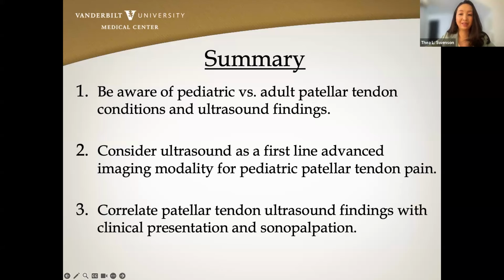And finally, we may see a lot of changes in the patellar tendon or anterior knee on ultrasound in these athletes, especially who participate in jumping sports. And the key is to correlate symptoms with ultrasound findings to determine when and where they actually have pain.